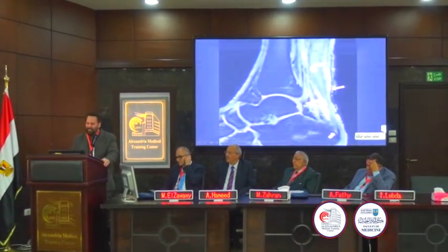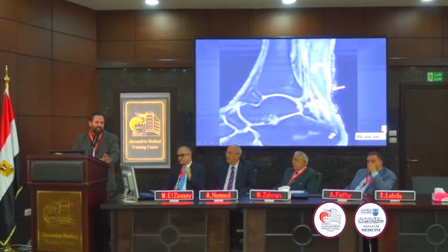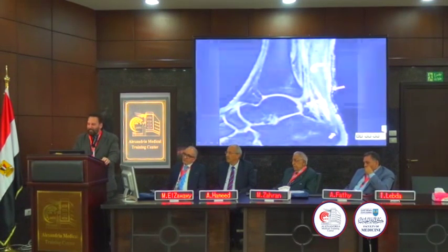So, I like this case. This was a case done for osteomyelitis. But at the edge of the film, you can see the vessel from the myotendinous junction coming in. Can you see that? It's a contrast image. And you can see the little vessel coming in from the enthesis. And you can see the blood supply coming through the peritenon. Kind of similar to what I showed you.